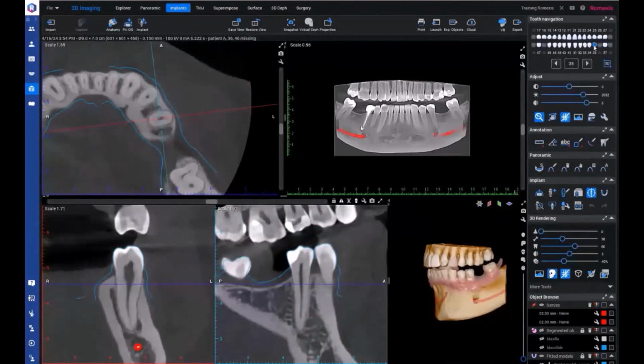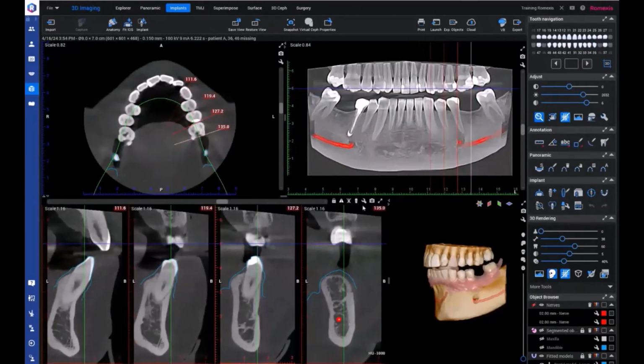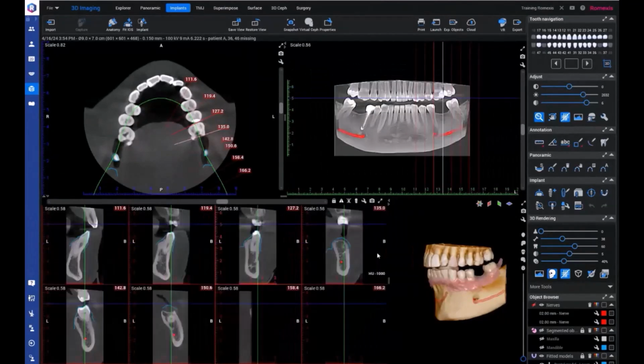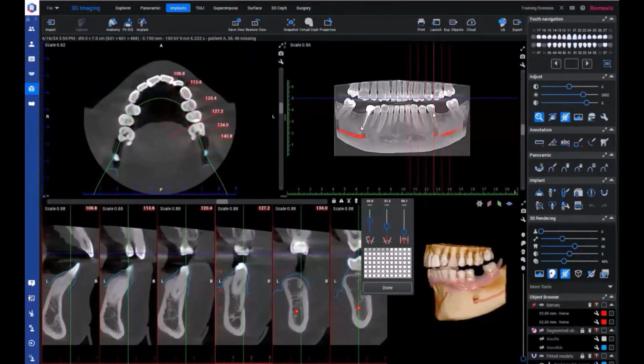Then also, if we now look back at the actual cross-sectional views, so first of all, you can here as well, just like we saw in the Explorer, under the wrench icon, have the settings. So you can here define how many slice views you want to see, in which order. You can define here also the distances between them. And you can see here, for example, now when I adjusted the distance, we have the cross-sectional slice lines shown in red.